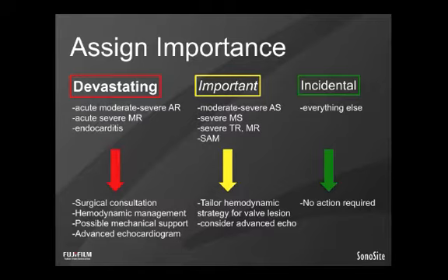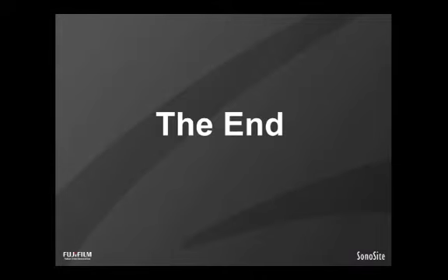Again, if you need clarity, a diagnostic or comprehensive echo done by an advanced echocardiographer would be a reasonable choice, given that we've acknowledged you must be humble about the complexity of assessing valves, and when in doubt, escalating is a very reasonable choice. But I hope I've armed you with sufficient techniques in this screencast to be able to take some matters into your own hands, and in particular to rule in lesions that you might otherwise miss or might go unnoticed for hours or days, when hours and days aren't friendly to the patient's condition and may therefore save a life or certainly expedite the right care at the right time for some patients.